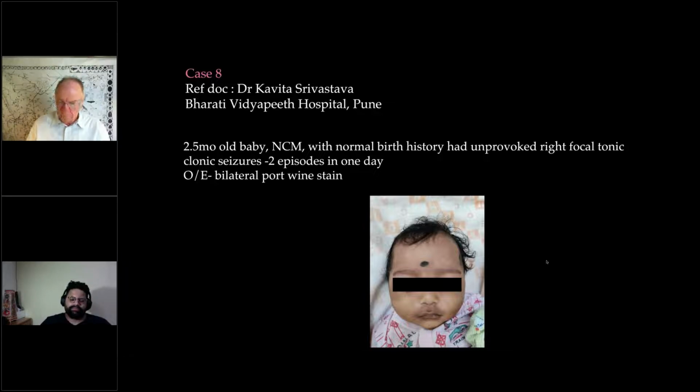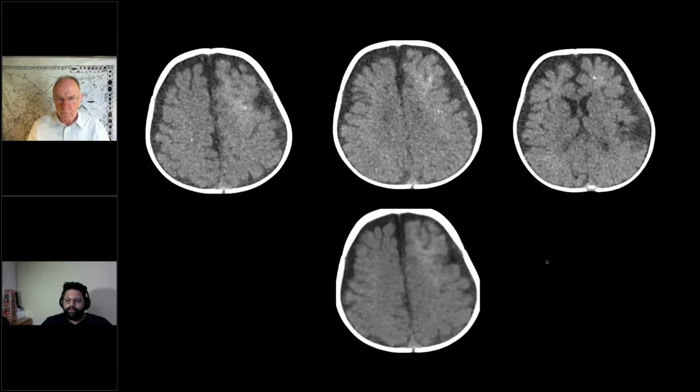The reason I was provoking this question was because yesterday we had a similar discussion with Dr. Sarah Ellett, who does most of the SWS work here in the UK. She asked me what is the right time frame, because can we pick up the pial angiomas early? And the answer is yes, but they do need an MRI and they need contrast, and they probably need a FLAIR contrast for that as well. But I think you have the answer on CT here as you were showing, so I'll let you proceed. I have the CT and MR. So, do you want to list out the findings?